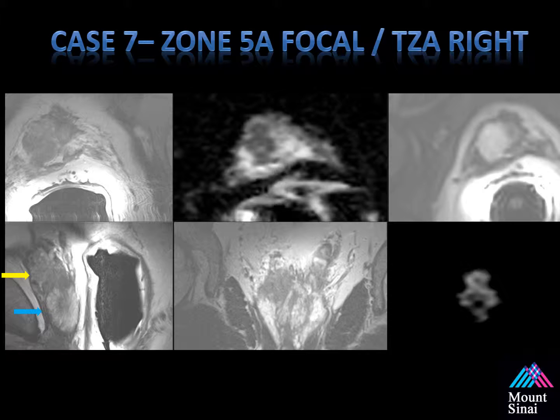Looking at the imaging, there are some arrows here, but notice how the prostate looks completely normal around the blue arrow. However, the yellow area shows a mass effect of an anterior lesion. This was a very interesting case. When you do an ultrasound biopsy, this would probably look like a normal prostate to you. However, this large anterior abnormality was seen on MRI and the ADC map as well as the enhancement. This is the coronal in the middle lower pane.